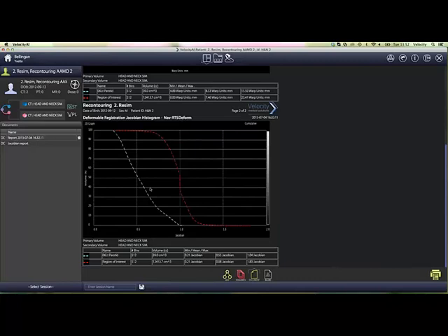And there we can see where the mouse cursor is now, we can see that there was a bit of expansion. But if I pull it back to the median value of around 0.55, it's giving me a color display of where I had my shrinkage and where most of this shrinkage occurred. All right? So from that point, that is how you can review your registrations and assess them. But as I say, you've got to look at it both visually as well as using your tool.